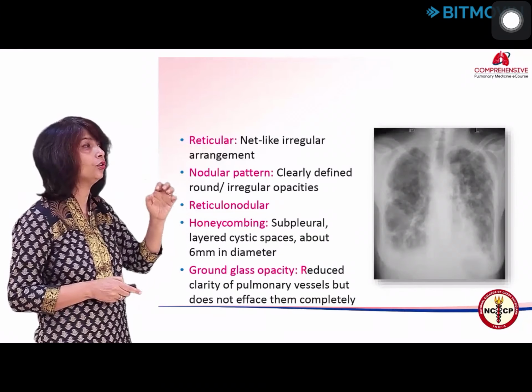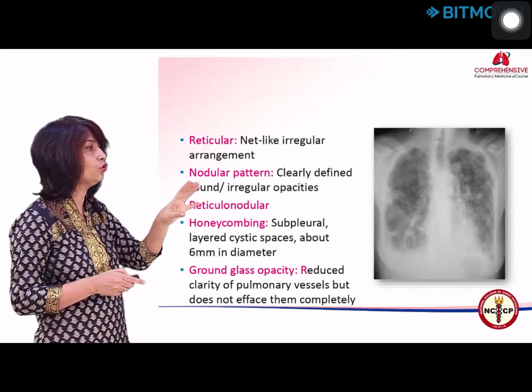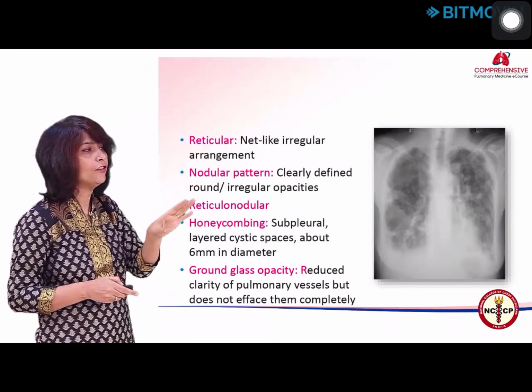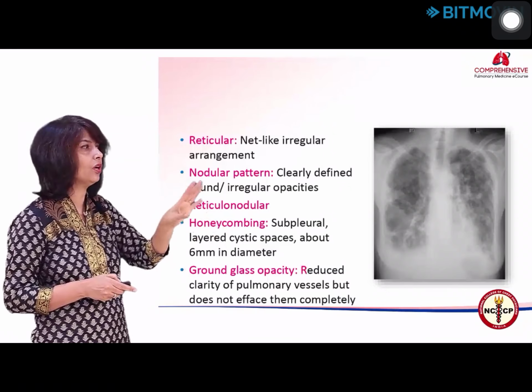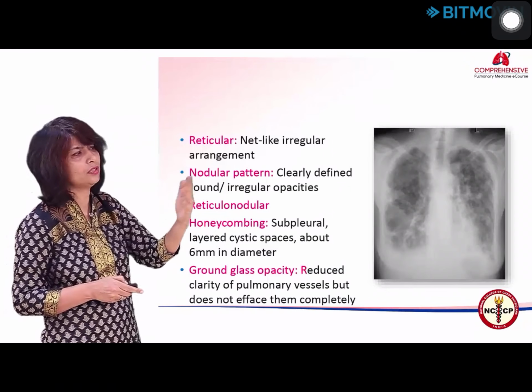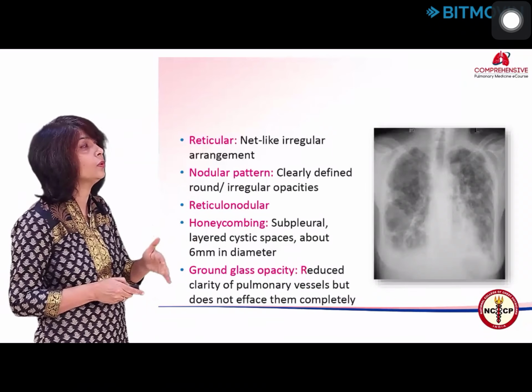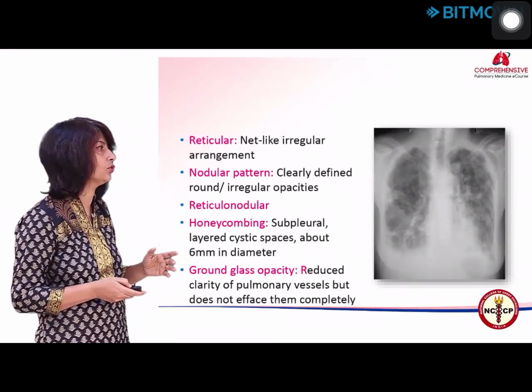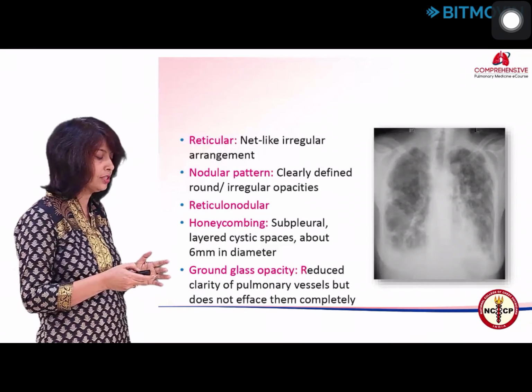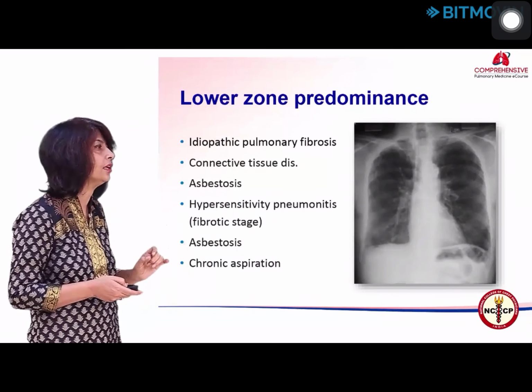In this patient, you don't have an obvious volume loss as yet, but eventually you will. But you do have a loss of definition of the cardiac borders and the diaphragmatic borders. You can't make out the interface, although there's no consolidation sitting next to it. So you know you're likely to be dealing with an interstitial lung disease, and which in this case is diffuse also. And then depending on the dominant pattern, you have the differentials. We can't see all of these now, we'll just see some examples.